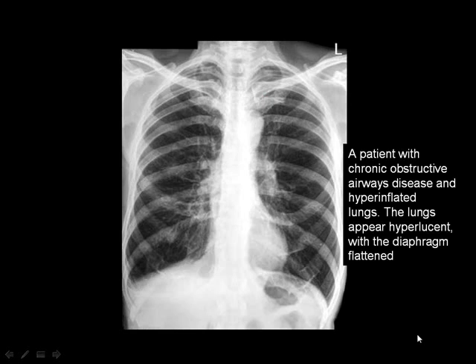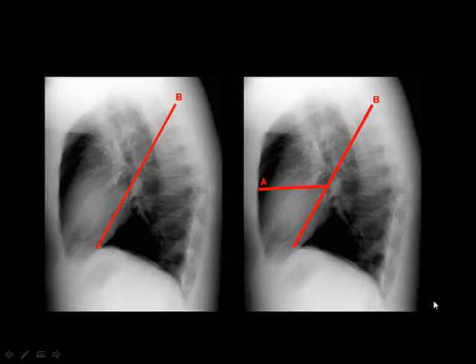And if you have the frontal chest x-ray, how can you report the site of the lesion? You know that the lung is divided into 3 zones. The upper zone is the region opposite the first and the second ribs anteriorly. The middle zone is the region opposite the third and the fourth rib anteriorly. And the lower zone is the rest of the lung until you reach the diaphragm. This is the upper lung zone, middle lung zone, and lower lung zone.